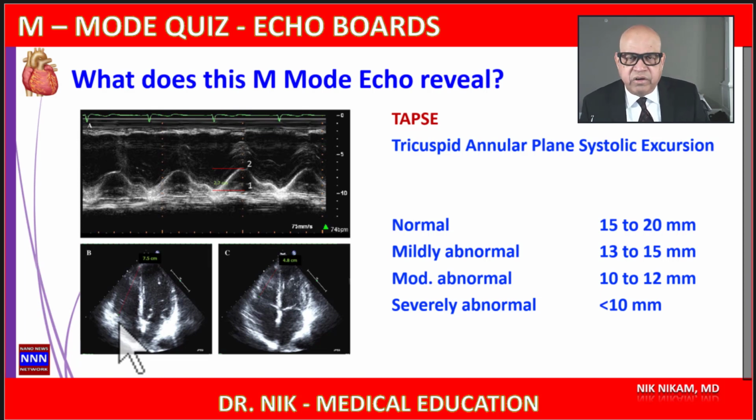That makes sense, especially if you're dealing with a patient with either left heart failure or a patient with chronic lung disease or sleep apnea who has unexplained right ventricular dilatation. Then it makes sense to find out if in fact the right ventricle is functioning normally or not.